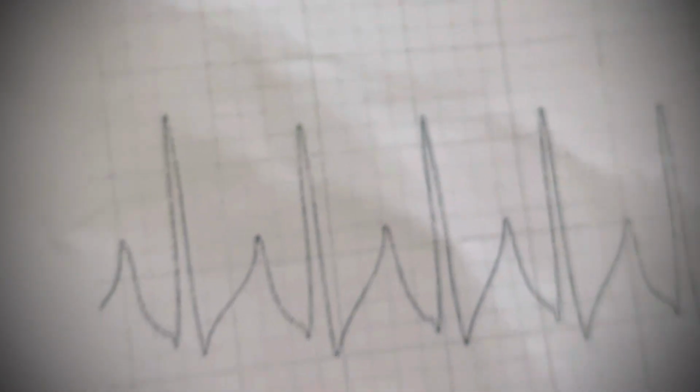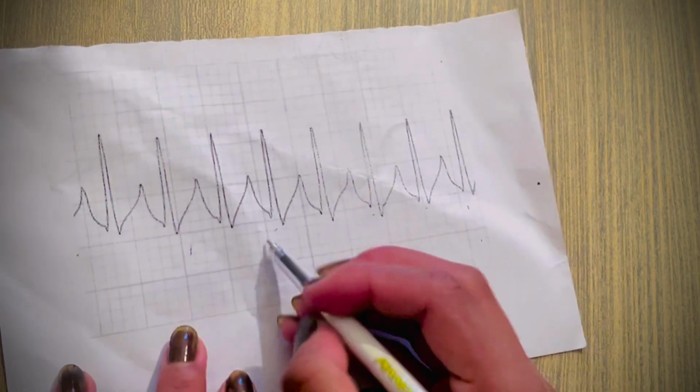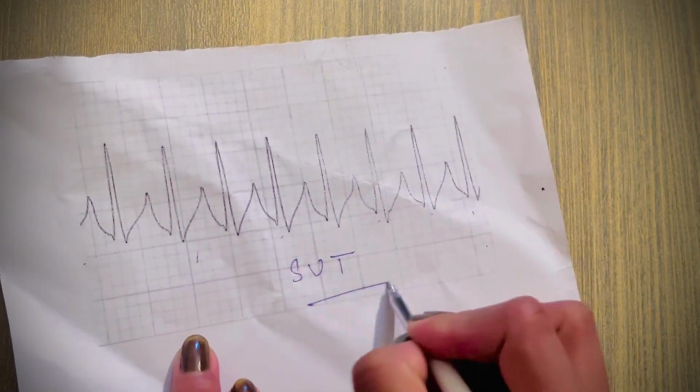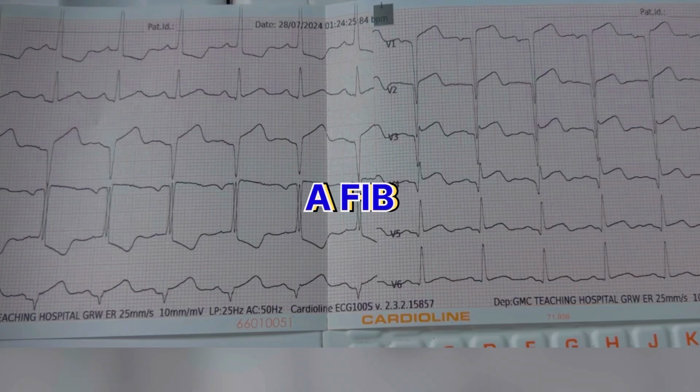If there is a P wave and rapid rate, it might be supraventricular tachycardia, SVT. Then there is AFib. AFib is characterized by an irregular pattern with no P wave. Next, we often see myocardial infarctions with the ST elevation.